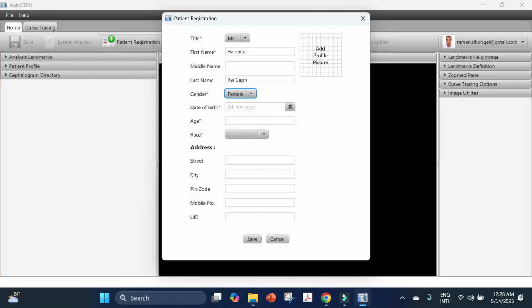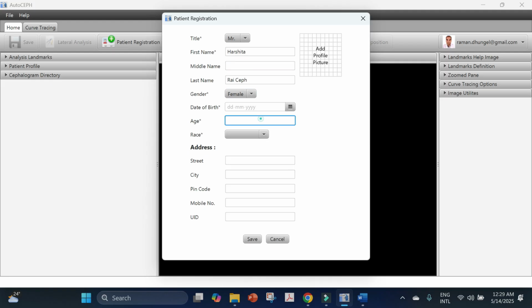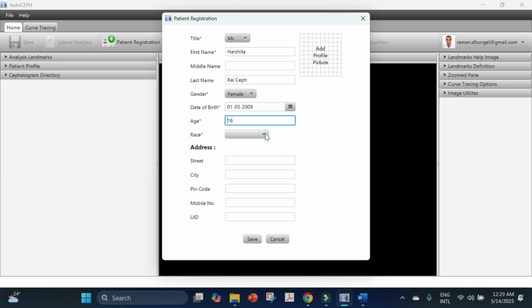She is female, 16. So I need to enter her date of birth, 2009. Now it's 16. That's good.